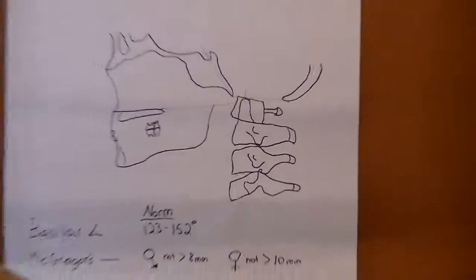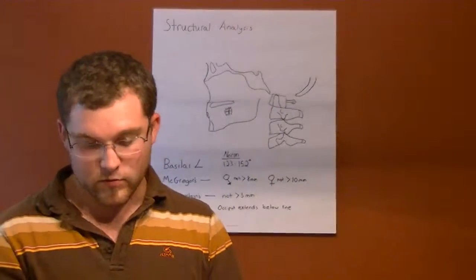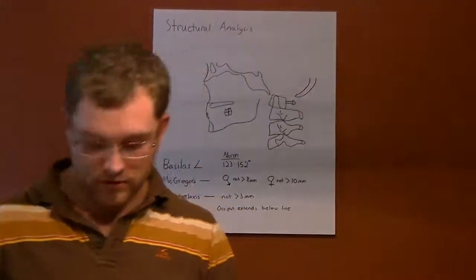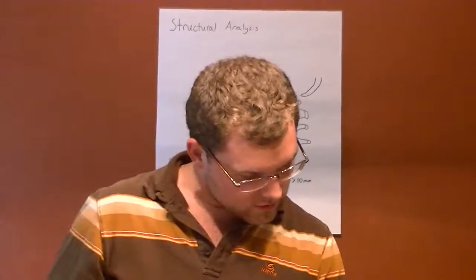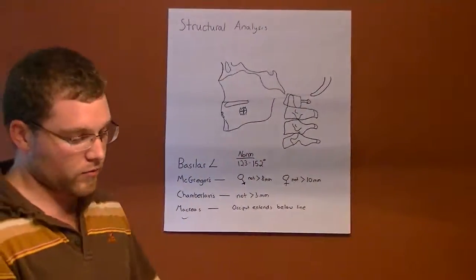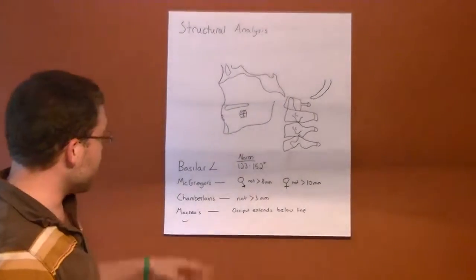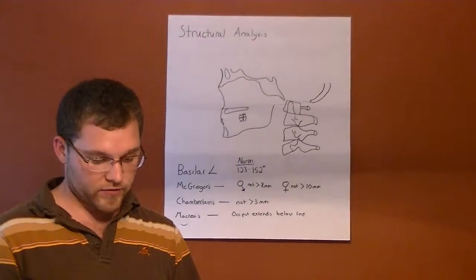We've mentioned platybasia a little bit during this video, and what platybasia is, is a congenital softening. Here we go. Let me just pull it up. Okay. It's a flattening of the sphenoid bone or the occipital bone, and we have 4 lines to measure this. It's not very common, but we have to know it for the test.